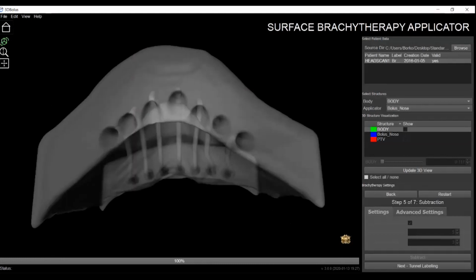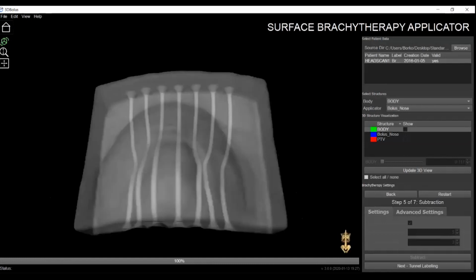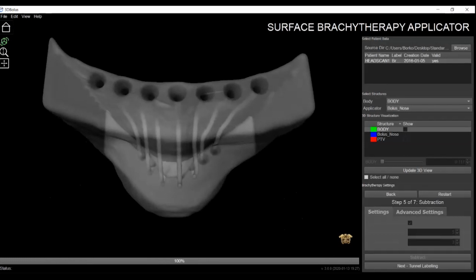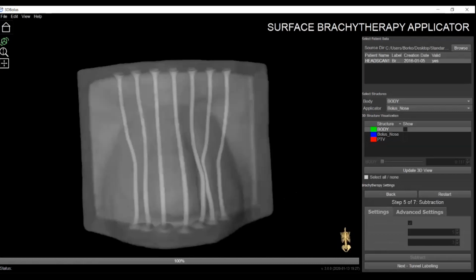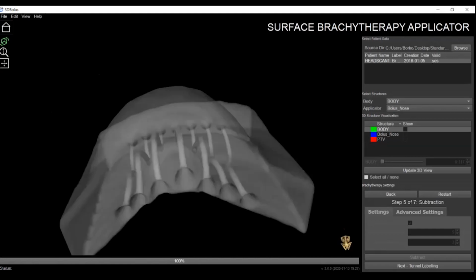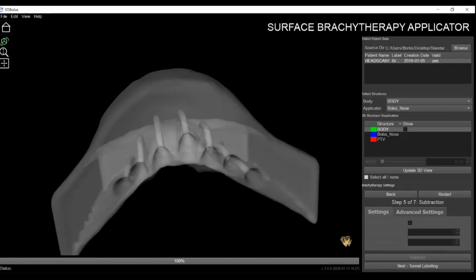But in mitigating this issue, we devised this feature where we can implement these countersinks, or cone-like endings, where users can control the height and the radius of the cone, and mitigate this narrowing of the tunnels on the bottom side of the device lying on the printer bed.